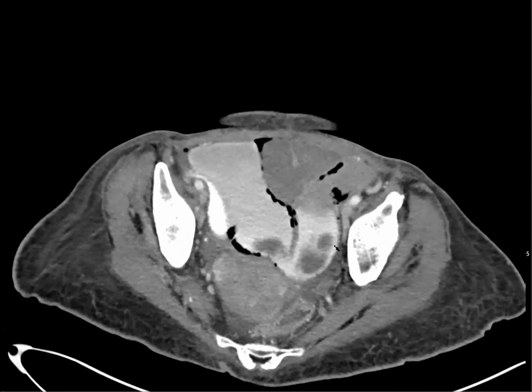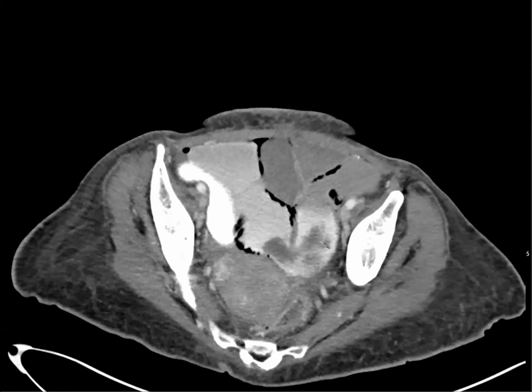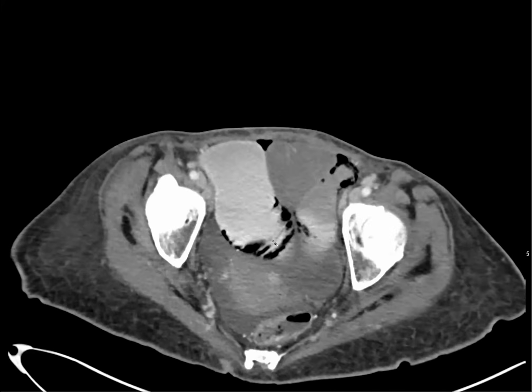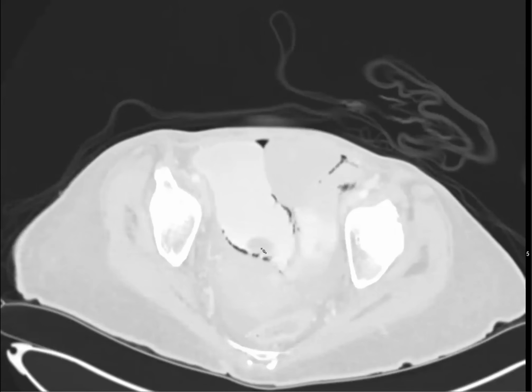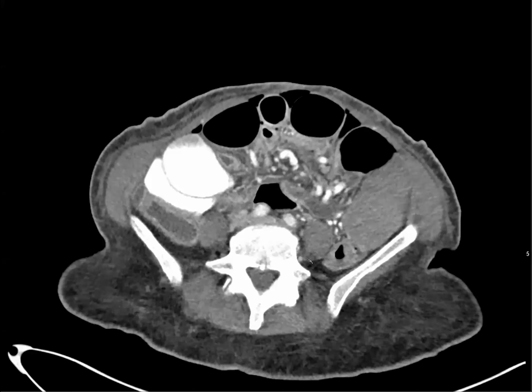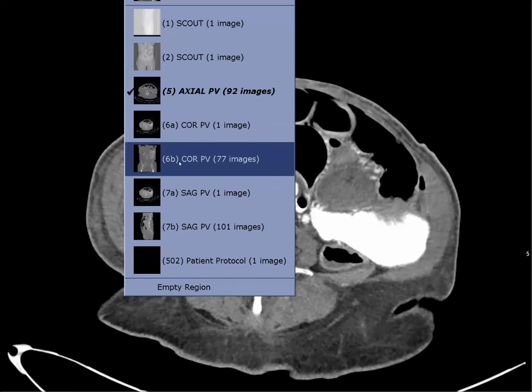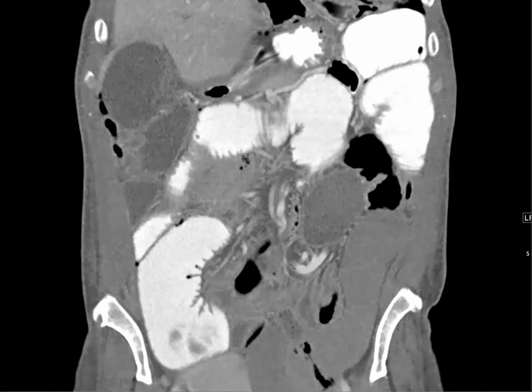And then do you see any other finding here? Pneumatosis? Yes. So here we've got pneumatosis of the small bowel. You can see its non-dependent ringing here. And then this is hidebound bowel. So what is the diagnosis? Scleroderma. Yes, exactly. So this is scleroderma.